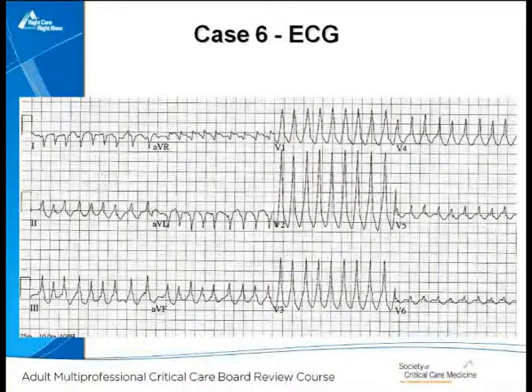So that means it's very unlikely to be ventricular. The QRS is very bizarre. So it's very unlikely to be a bundle branch block, particularly in a 17-year-old, and it's absolutely typical for an accessory pathway, for a pre-excited rhythm. So this is pre-excited atrial fibrillation.